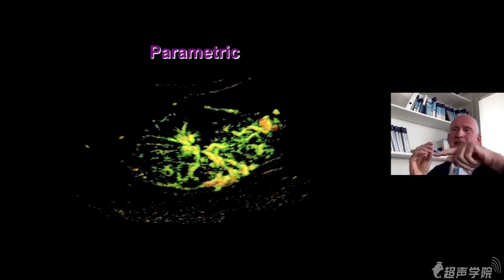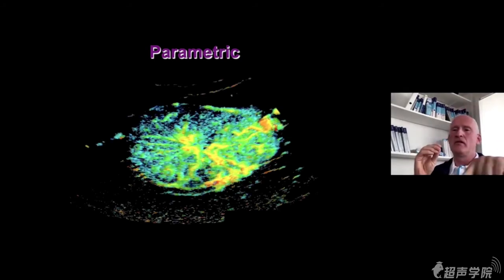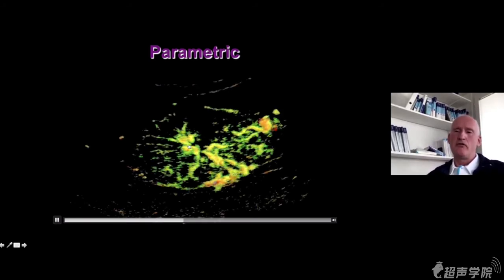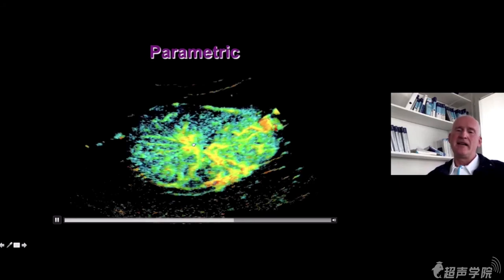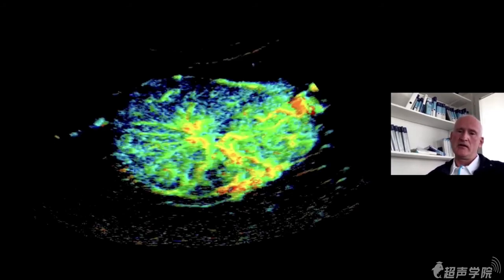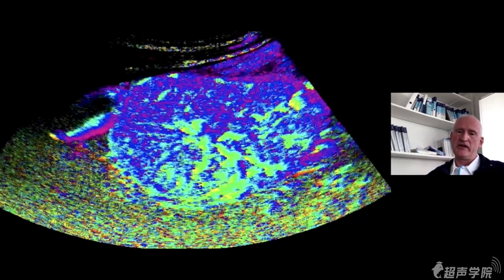We know it's a centrally enhancing liver lesion. Malignant ones would be aggressive at the border, destroying the neighborhood. But here we can see it's a typical benign focal liver lesion, with highly architectural vascularity and a typical focal nodular hyperplasia, showing the timeline of enhancement.